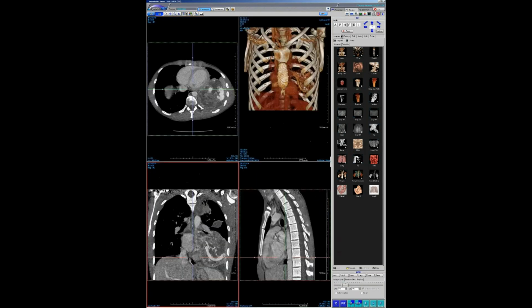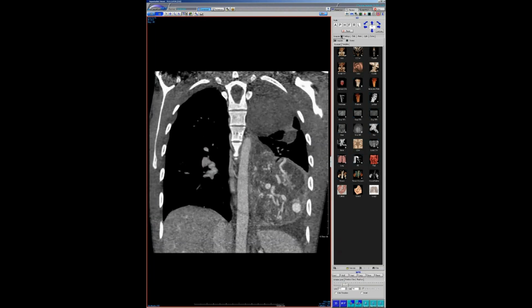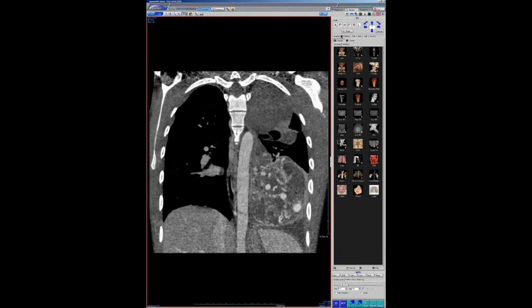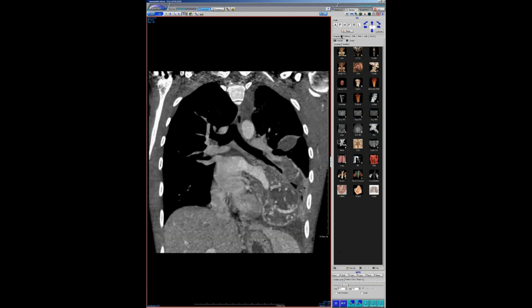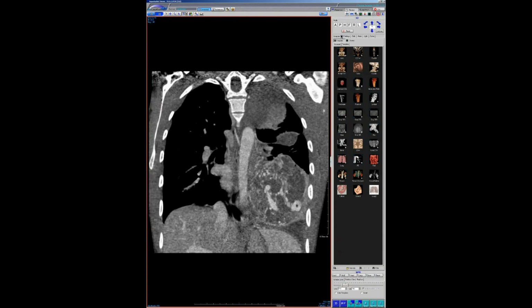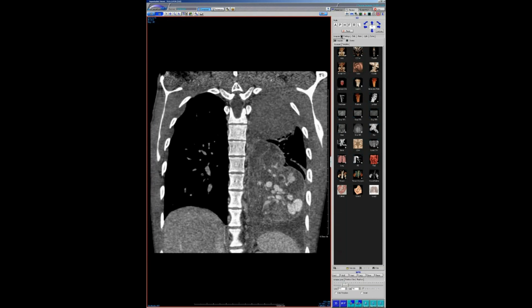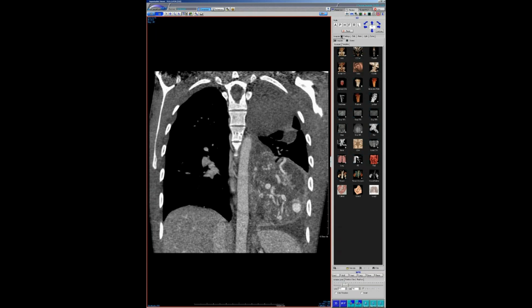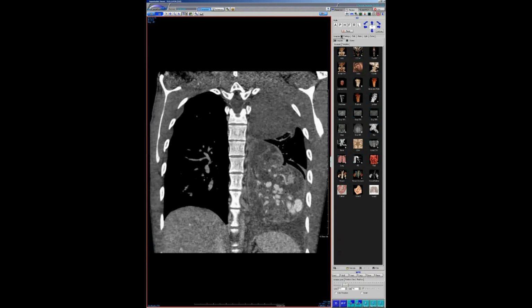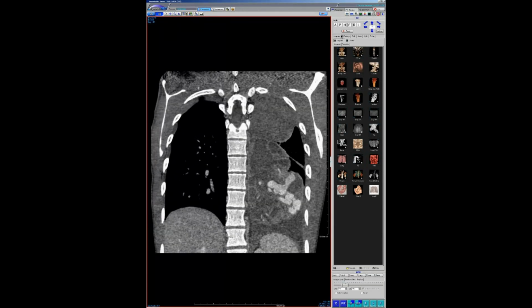But I've just never seen anything like this before. So where does that big vein go? You know what, Dave? I tried to follow this thing for like an hour before I just gave up because it just makes a circle. So it's a circle, comes up and goes up and then connects to another vein. If you follow this thing up, this thing here, that's a vein. It goes back in, back to the central vein, and then there's another portion that goes up. But honestly, I just got tired of following it.